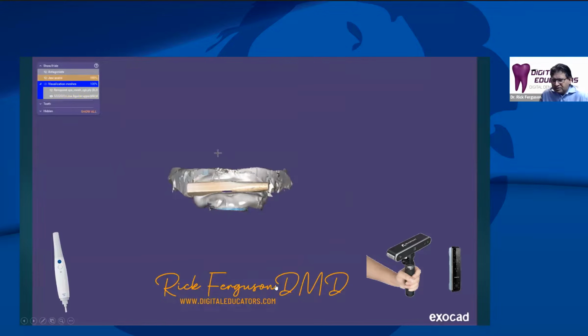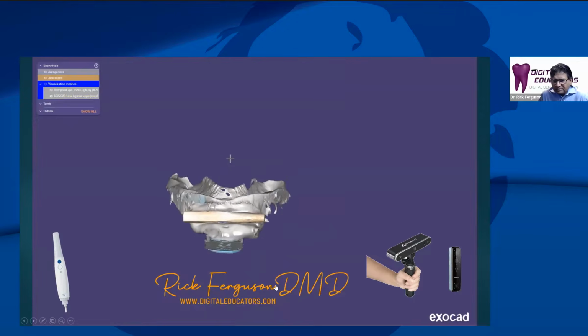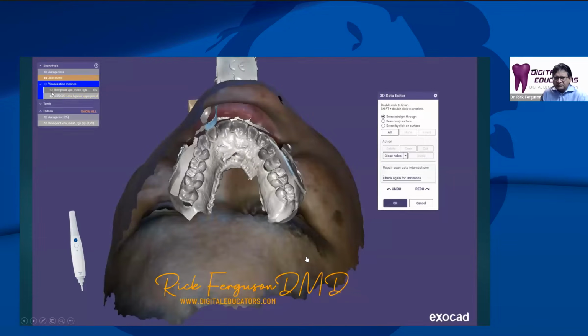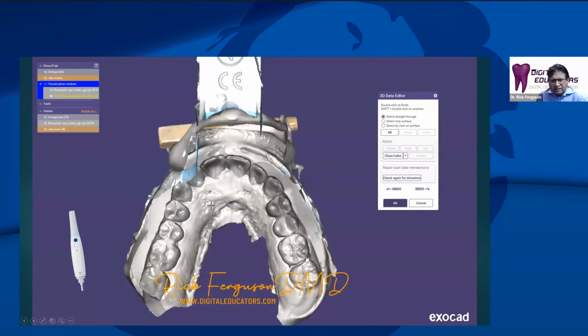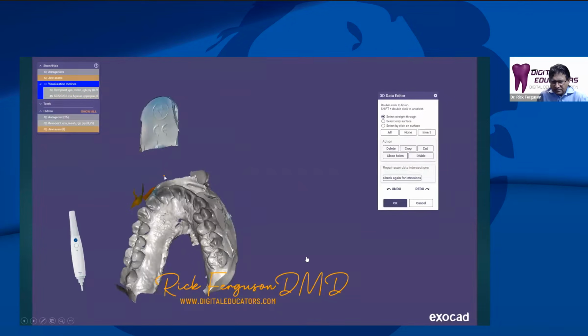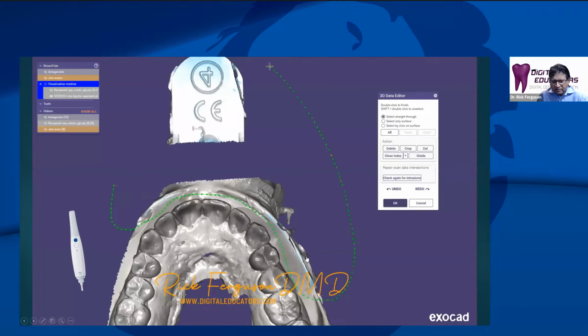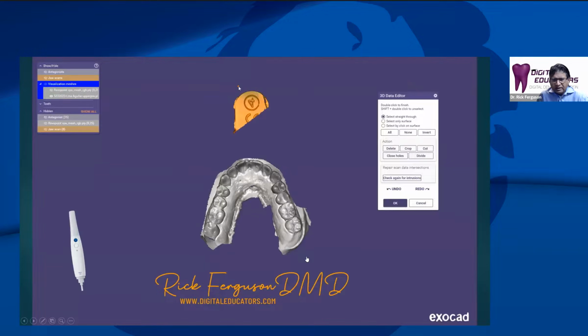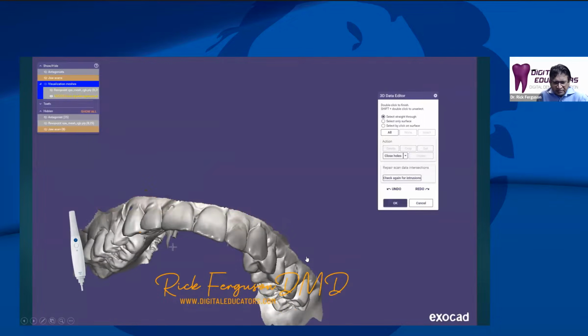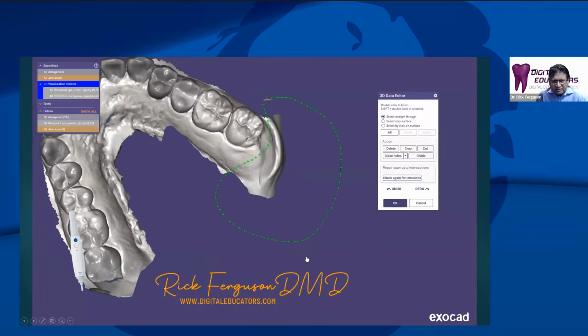We can then use those teeth positions and align that to the CBCT, because that's typically how we're doing things anyways. Now, this, of course, is an inverted impression. I mean, it's an impression, so that the image is inverted. So in exocad, you have the functionality of being able to clean up that intraoral scan. It's already aligned, so now we can go ahead and get rid of the impression part and the tray. And it's an inverted image, meaning the triangles are basically upside down. So you can fix that in exocad.